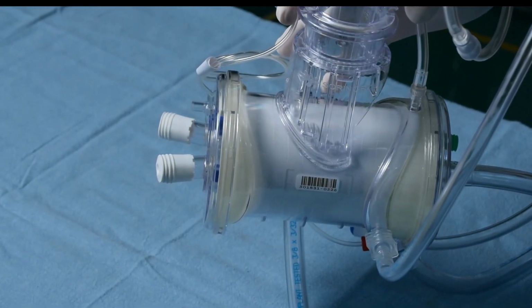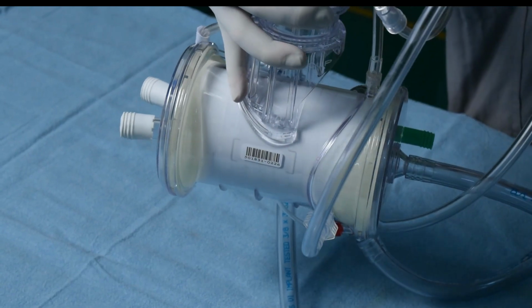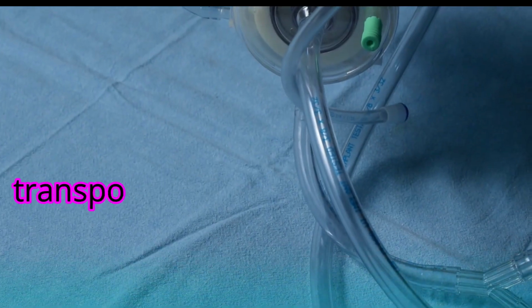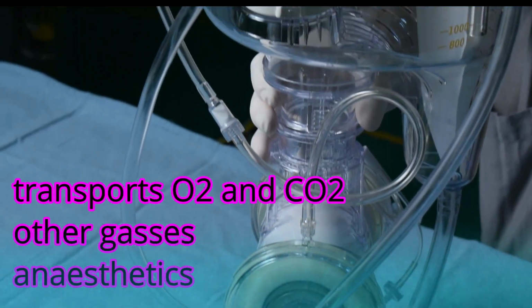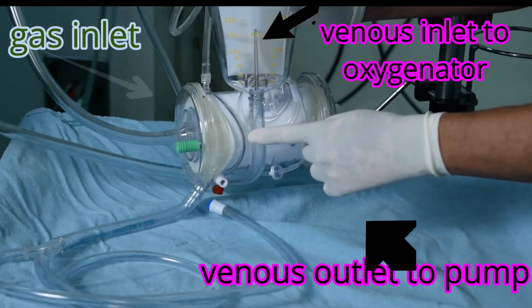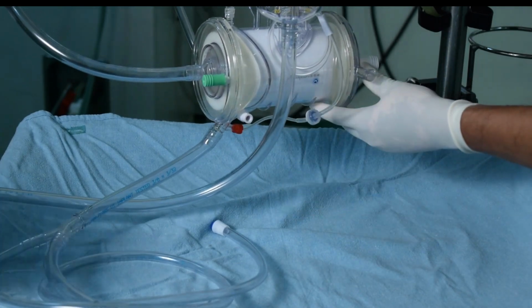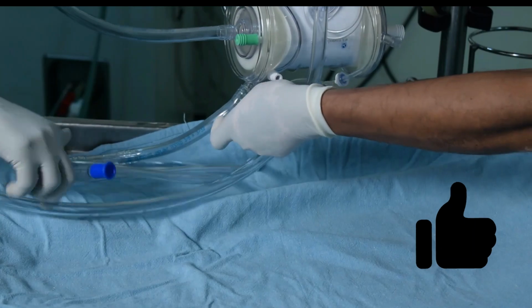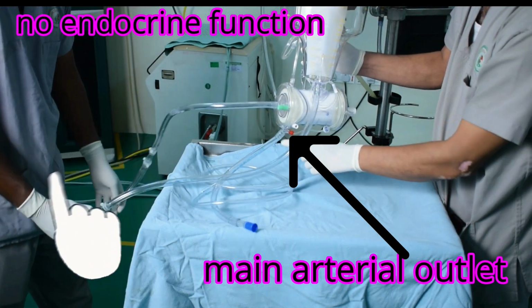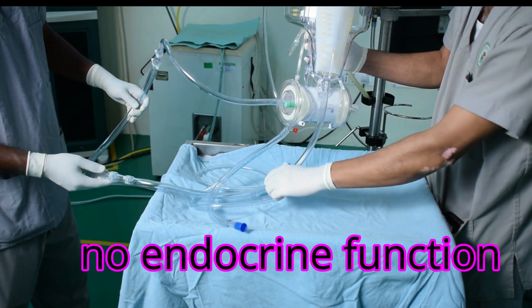The term oxygenator has come to mean that portion of the perfusion apparatus that serves the function of the patient's natural lungs during the period of cardiopulmonary bypass. It also transports carbon dioxide, anesthetics and possibly other gases into and out of the circulation. All modern oxygenators have integral heat exchangers and also serve as the main reservoir and a filter for blood returned from the cardiotomy suction. So if you look at the oxygenator, it performs all major functions of the natural lungs except for their endocrine function, which I guess can be suspended for the short duration of time the patient is on cardiopulmonary bypass without any ill effects.